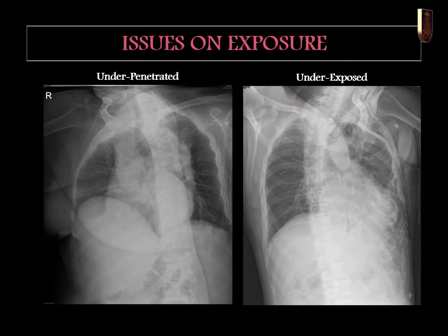Nowadays, with the utilization of digital imaging, issues of overpenetrated or overexposed images are seldom. However, issues of underpenetrated or underexposed images are still apparent. Therefore, it is important to critically evaluate the visualization of the bony cortical outline and trabeculae of the thin and thick structures as I mentioned before to justify correct exposure factor.